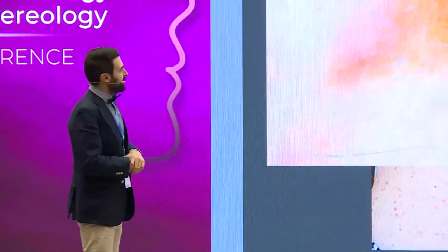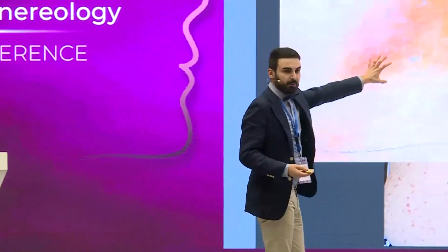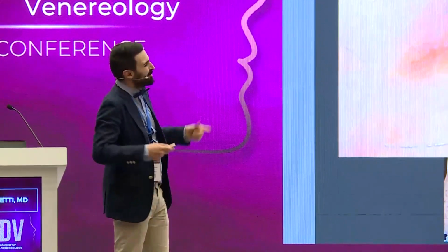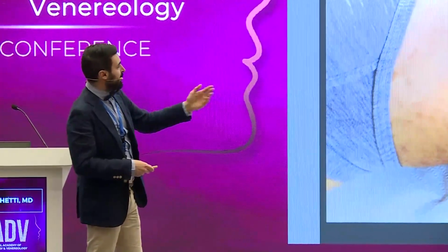Okay. Let's take a look. The dermoscopic pattern is completely different. Yeah, urticaria pigmentosa, the brown network. And here we have dots, which are brown. Lichen pigmentosus. Also, maybe. Okay, here. So, they were kids.